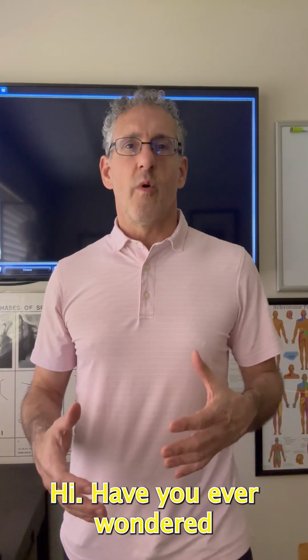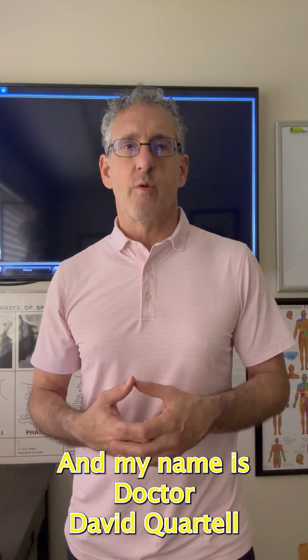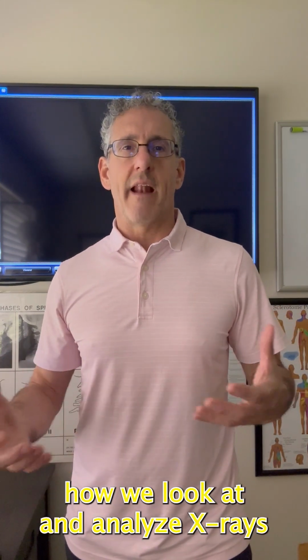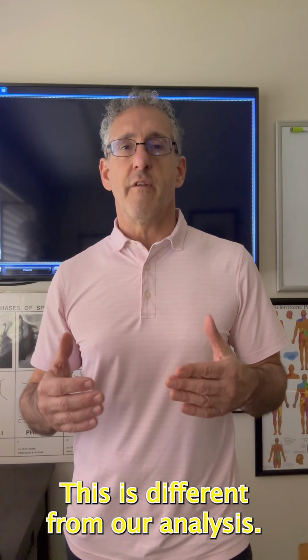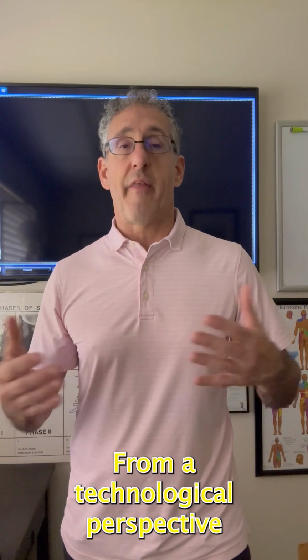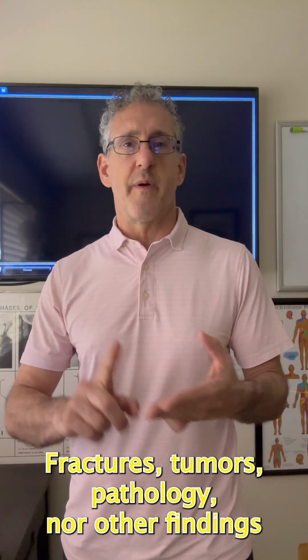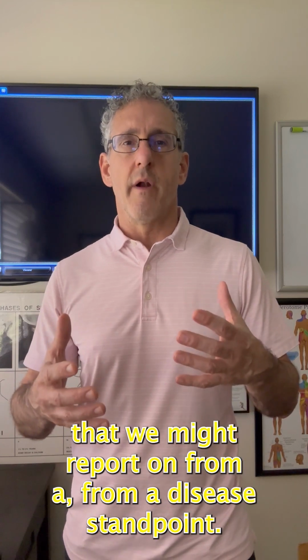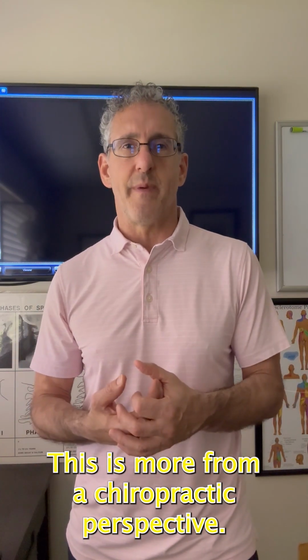Hi, have you ever wondered what a chiropractic X-ray analysis might look like? My name is Dr. Quartell from Quartell Chiropractic, and I'm going to go over today how we look at and analyze X-rays from a chiropractic perspective. This is different from our analysis from a pathological perspective. We're not going to be covering today fractures, tumors, pathology, or other findings that we might report on from a disease standpoint. This is more from a chiropractic perspective.